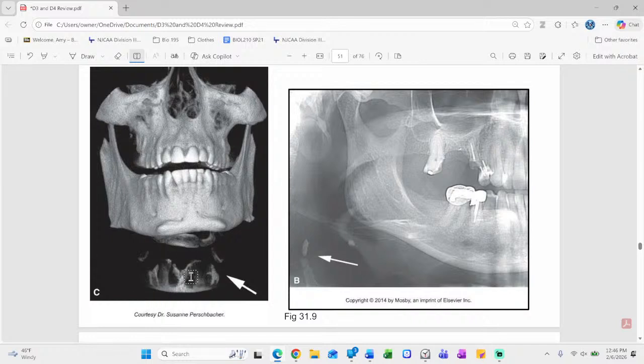So this is the cornu, those top extensions. This is what it looks like. This is the triticeous cartilage up on top. I don't often see the triticeous, every once in a while, but this is normally what I'm seeing, that portion, the cornu of the thyroid cartilage. And I have to be able to distinguish that from carotid plaque.